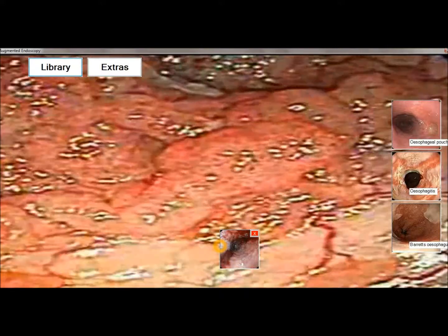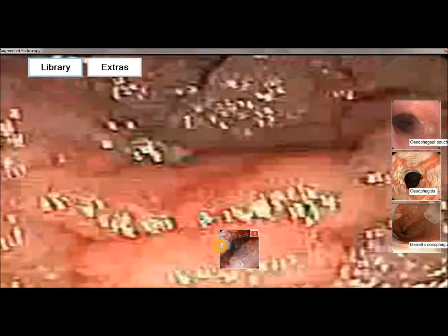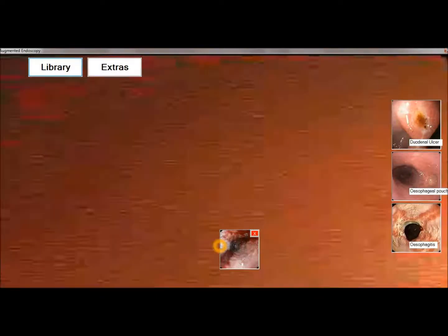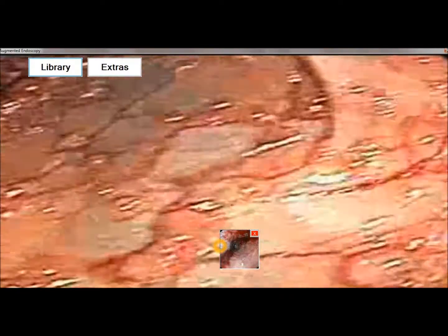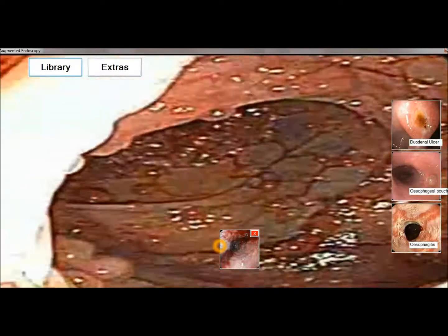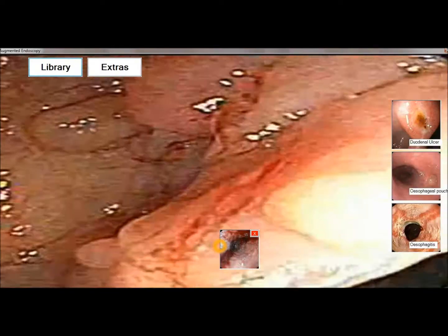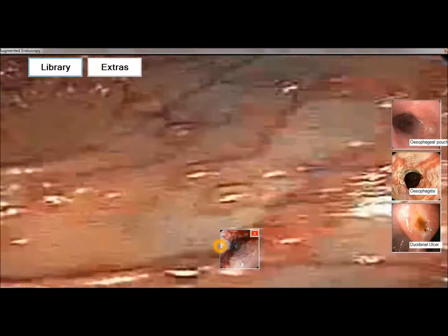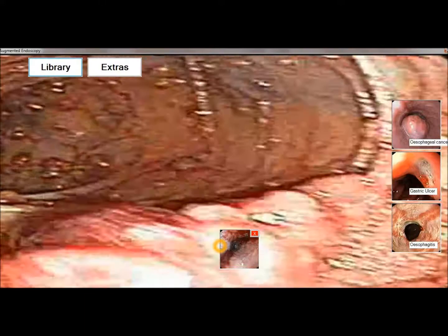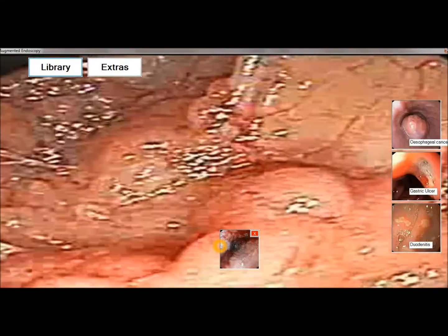It then takes this threshold image and runs a canny edge detection across it. This provides an outline. This outline is then thinned to a distinct shape, and this shape is then compared to see if it matches the shape of a polyp or a pedunculated polyp.